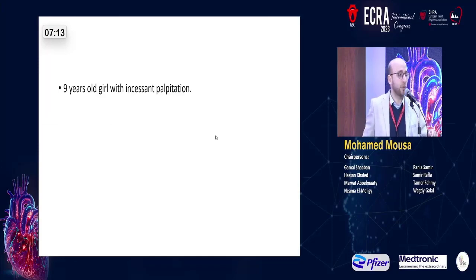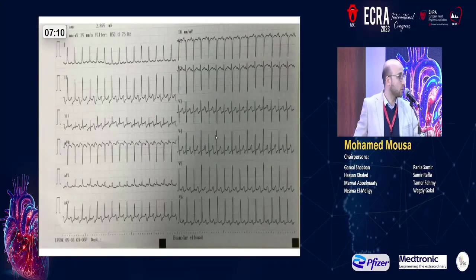A 9-year-old girl with an incessant palpitation. دي أنا عارفاها على طول. العينة بتاعتي.